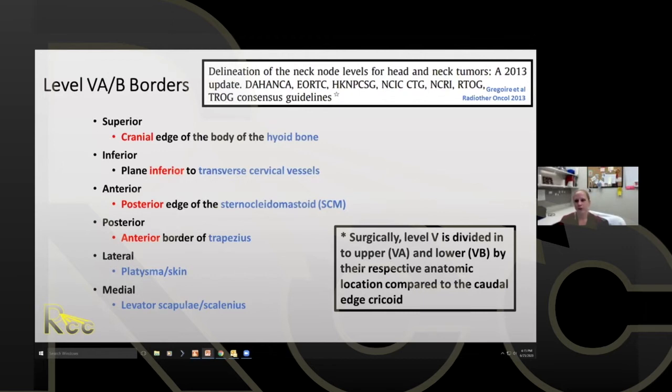And that's different when you're comparing the tracheal rings. So the tracheal rings, those cartilages exist only along the lateral and anterior aspects. So there's no posterior aspect. It's not 360 degrees. So it's very easy to see the esophagus bulging right into the trachea. So as you're scrolling through that CT, you're looking for the cricoid cartilage. That is a full circle, a full 360 degrees. And then as soon as you do not see cartilage posteriorly, then you know you've reached the bottom of the cricoid. Very good.